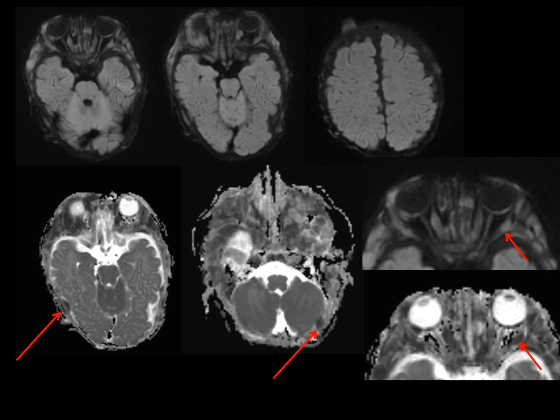And I showed you that if we want to see something in T2 or in T1 post-contrast, we need to get rid of the signal of the fat, and that's very, very important. However, the fat signal can also be your friend. When can it be a friend? When it comes to T1 pre-contrast.